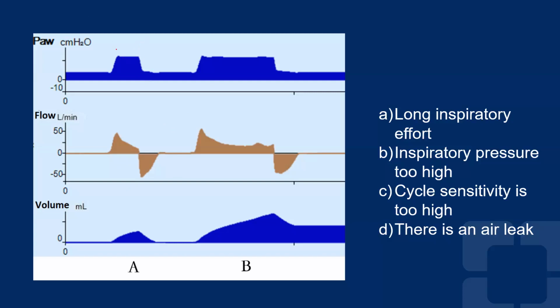And I just put this image here for you to remember. This is what we call the square root sign. And so for those that tremble when listening to math, it's this feature in which the volume doesn't return to zero, and then the ventilator always resets back to zero to start the next breath. If not, it would continue to climb and whatnot.